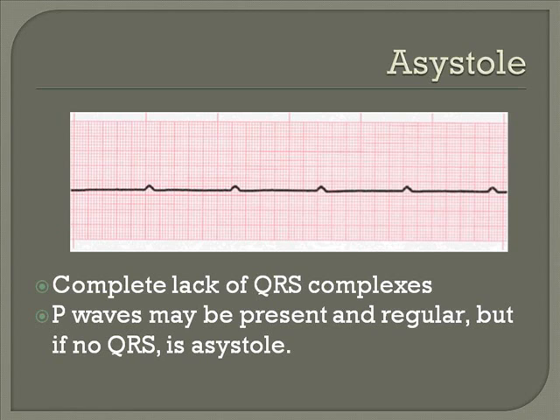As you might remember from the AFib, the atria are not really contracting, but the ventricles are still contracting, so that person can survive with that for decades. This person will not survive more than a few minutes without some kind of intervention. Only hope for this person is beginning CPR immediately and hoping their heart wakes back up at some point.